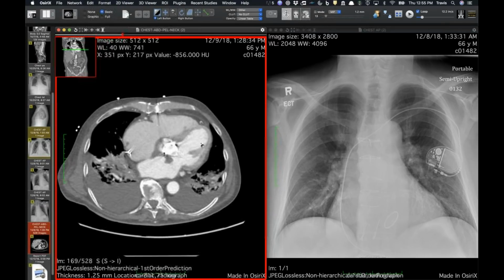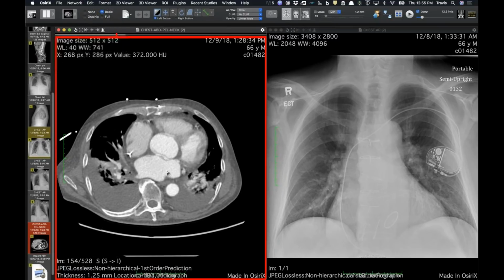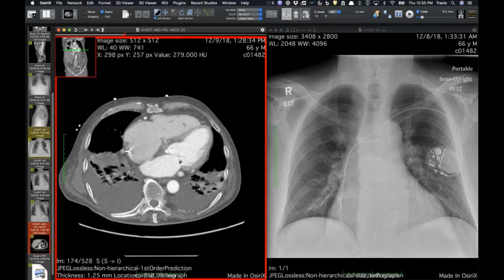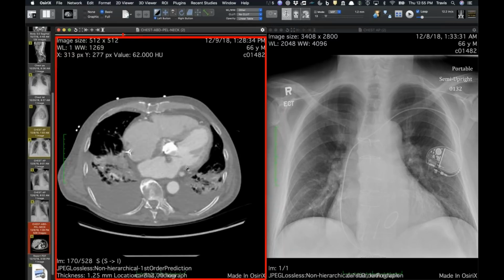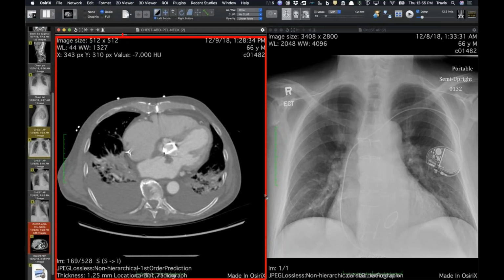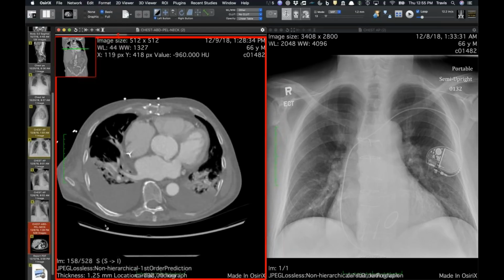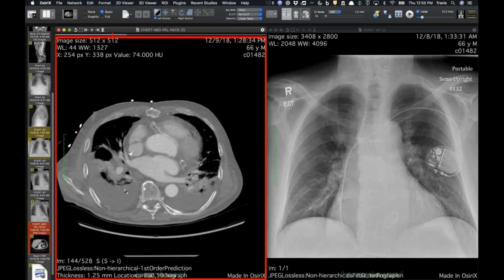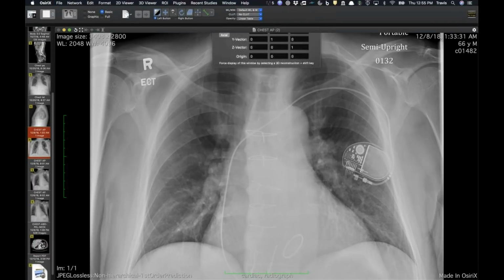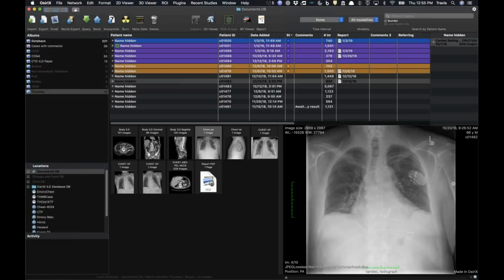I can't remember if this is the same one. Maybe this is the same one that I showed you, but I didn't have it noted that I'd shown this one. But this is one where there's a huge vegetation. Okay, so maybe I did show this one. Sorry. With the fistula to the left atrium and the right atrium. Yeah, you showed us this one. Okay, well. Yeah. All right. Well, then I'll show it. Yeah, sorry, the radiograph is the fun finding.